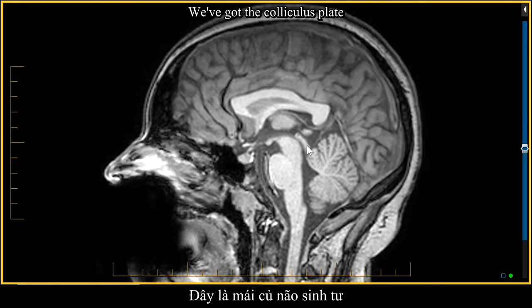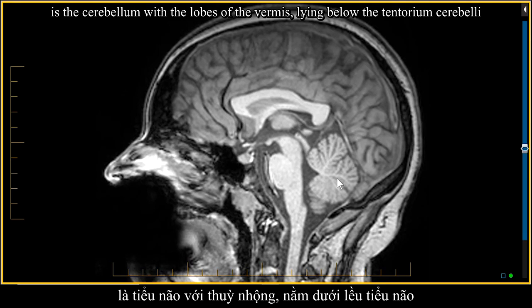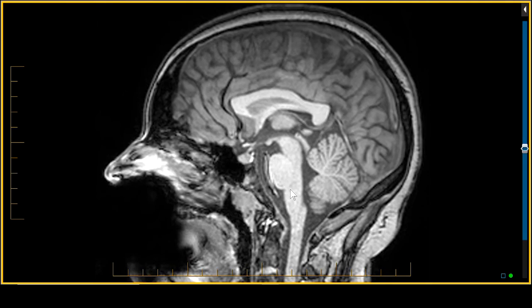We've got the collicular plate, the inferior colliculus, and the superior colliculus. Behind that is the cerebellum with the lobes of the vermis lying below the tentorium cerebelli, and there's the straight sinus and vein of Galen.